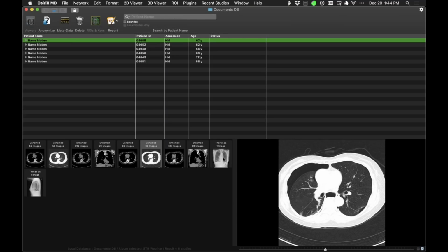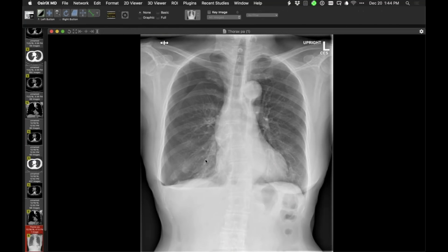This is an interesting patient. This image shows that she was symptomatic quite recently because of a pneumothorax. There is not only pleural air, but there's also pleural fluid. So one can make a diagnosis quite readily of hydropneumothorax and wonder why it might be present.